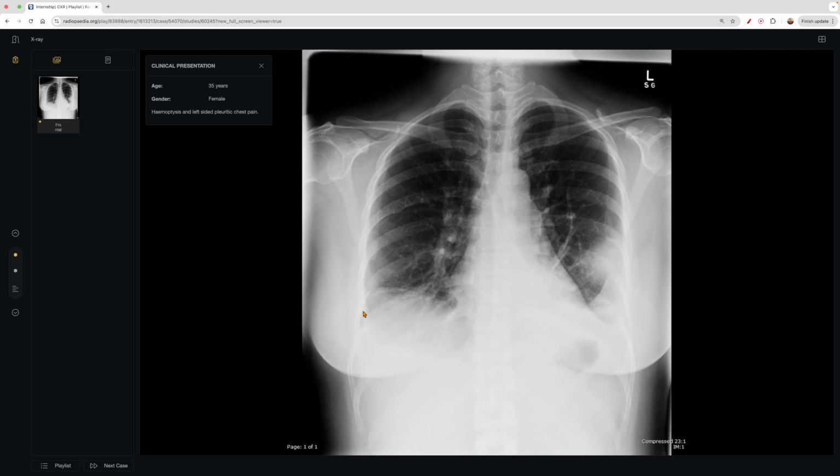Again, there's something to keep in mind. And then we go back up. Super lucent, but that's okay. And then we come down, go up, and do a whole search pattern, and we can see we're still left with this consolidation.